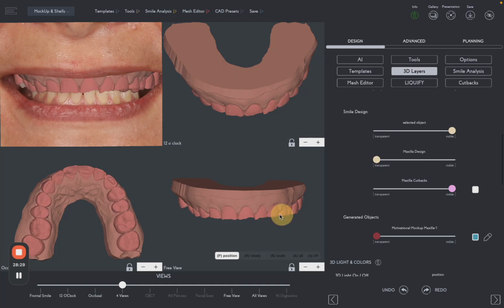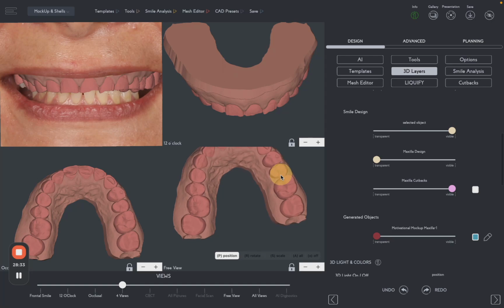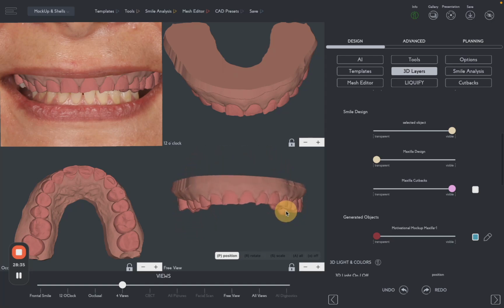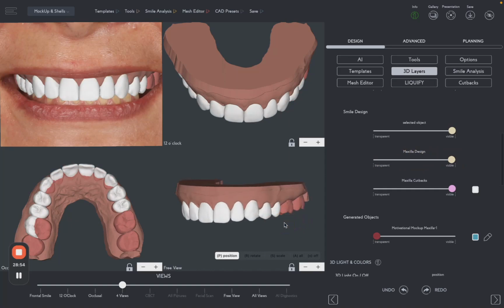So this is a really good example of that, where you can see that we need to recreate the proportions of the teeth, occlusion, restore basically the majority of the aesthetic and function. It is great for planning the final prosthetic restoration because it gives the dental technician already an idea about the final position of the teeth, and it acts as the blueprint for veneers, crowns, or bridges.